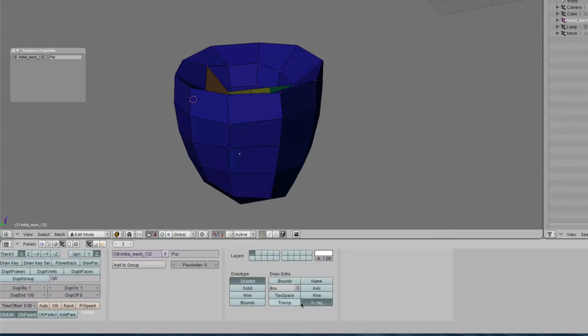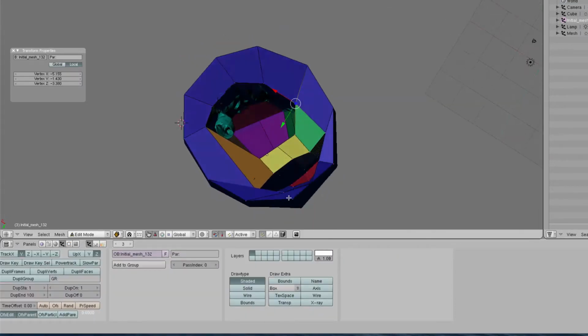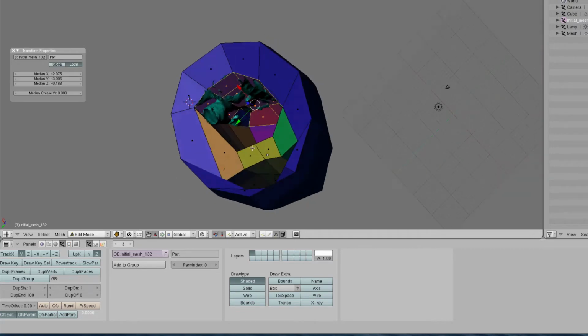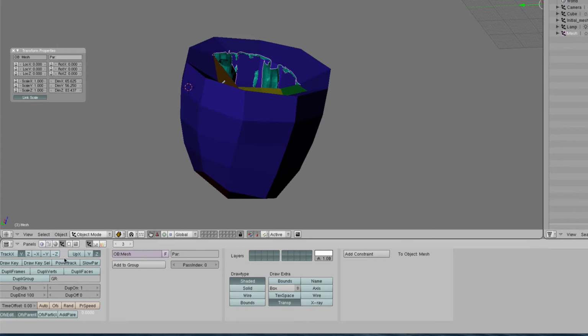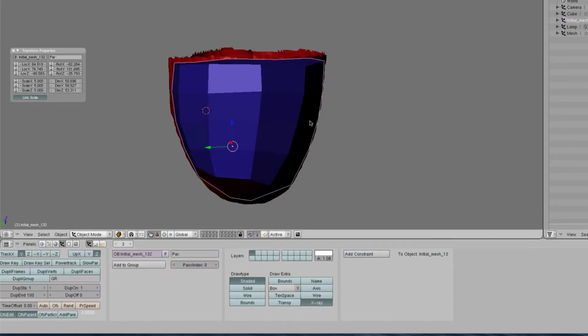When you're done, check all materials to make sure that your elements are rectangular and capture the general shape of the data. Don't be too worried about local features. You mostly want to get the general shape right.